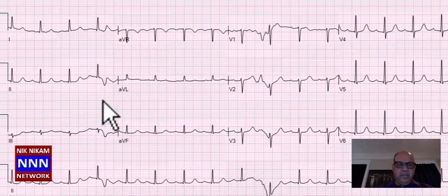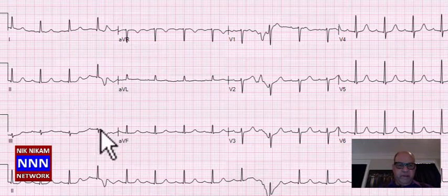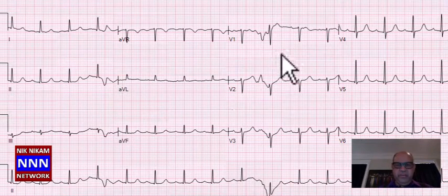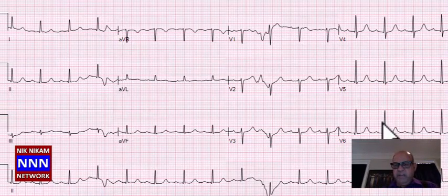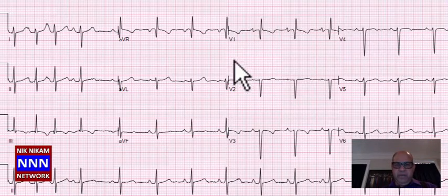Okay, here is a sinus rhythm. High anterior looks okay. Inferior leads, little flat T waves, and anterior leads, R wave progression is not great. Again, this may be related to lead placement. The lateral leads look okay. So basically, a normal electrocardiogram.